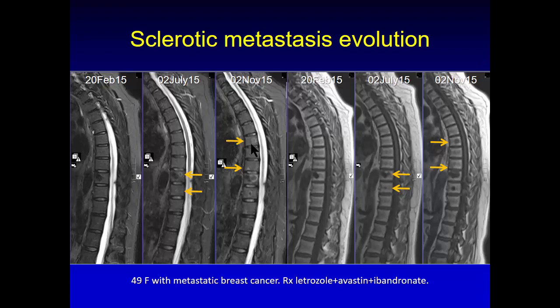So this ring that develops around these lesions, in fact, represents the area of osteolysis. This is where the osteoclastic activity is increased, and that delaminates the bone, enabling the tumor to get larger.